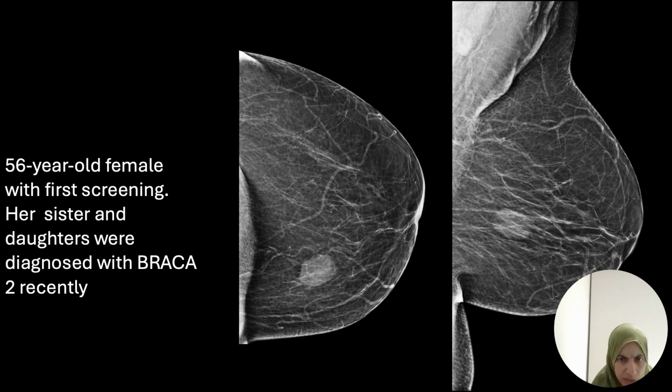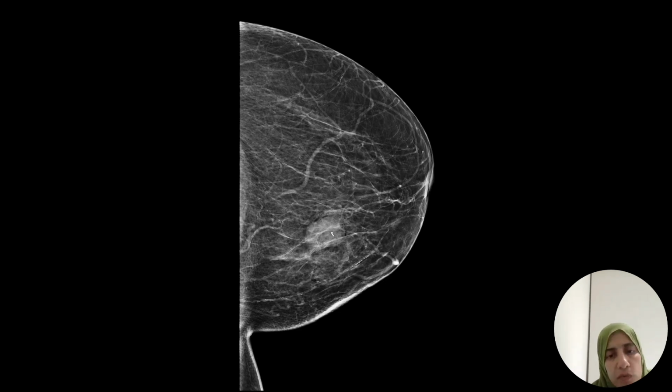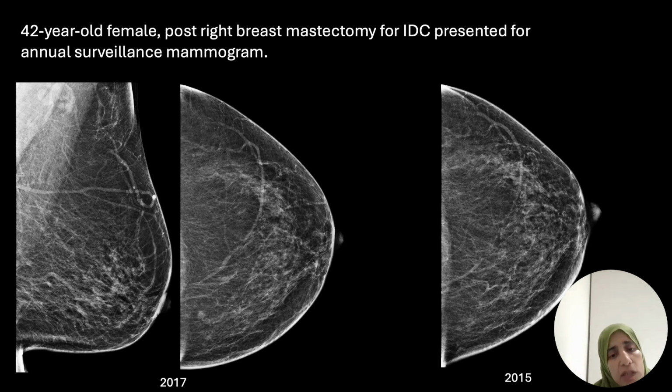Another patient who is BRCA positive, has a strong family history. Screening, we detected this lesion. By mammo, it looks benign, but in a patient with strong family history, we always have to biopsy this, especially if it's first time detected. And we looked very carefully for the lesion. It was very isoechoic. We have to optimize the setup of the ultrasound to be able to say, yes, it's this. We biopsied it. We left a clip to make sure that, yes, what we biopsied was that, and it was likely a fibroadenoma.